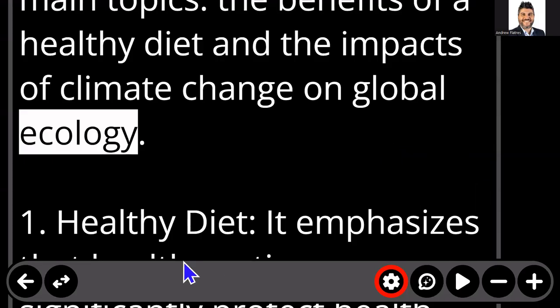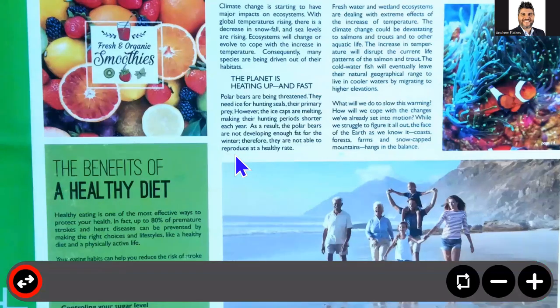Over in the far bottom left, there is a single left-facing arrow. This would return me out of the AI assistant to my live view. Not ready to do that just yet. Immediately to the right of it are two arrows, one facing right and one facing left. This allows me to toggle between my chat and the captured image that was sent to the cloud.